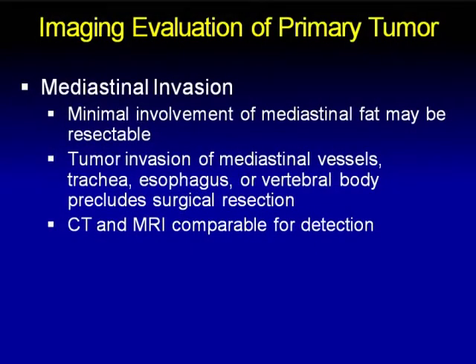In terms of mediastinal invasion, minimal involvement of mediastinal fat can be considered resectable. Tumor invasion of vessels, the trachea, esophagus, vertebral bodies, obviously is going to preclude surgical resection. And here CT and MR are really pretty comparable.